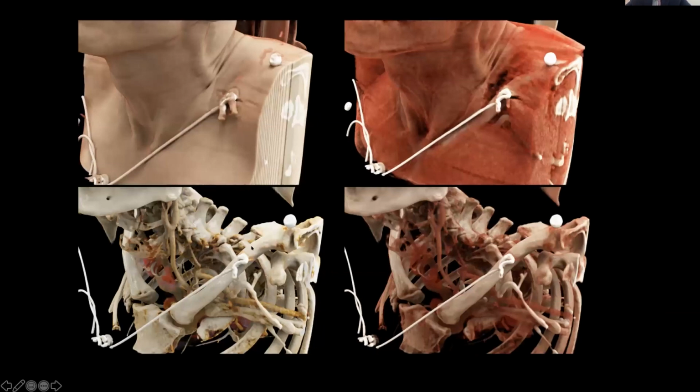Sorry, I was going to ask just a quick question regarding this topic specifically, if that's okay. I've seen this a lot on my rotations, and it's always been super exciting and super helpful. Just from your perspective, a question I've always had is, can we totally rely on these 3D reconstructions for their anatomy? How accurate are they in your opinion? Can we depend on these things when we're thinking about surgical approaches?